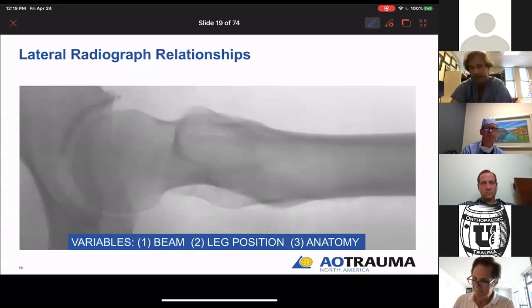In fact, it was variable, and it was purposefully variable because the insertion guide for the device wasn't radiolucent, so I couldn't see what I was trying to see in a true standard lateral, which is what I'm trying to represent here. So let's talk about a standardized lateral for the proximal femur.